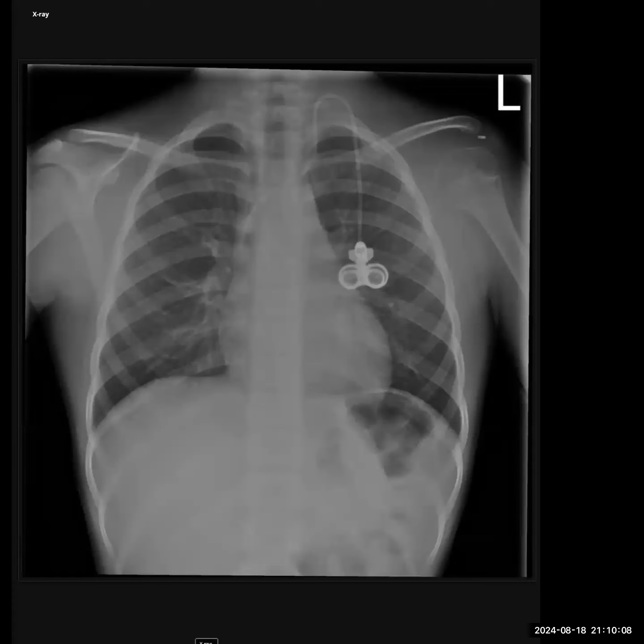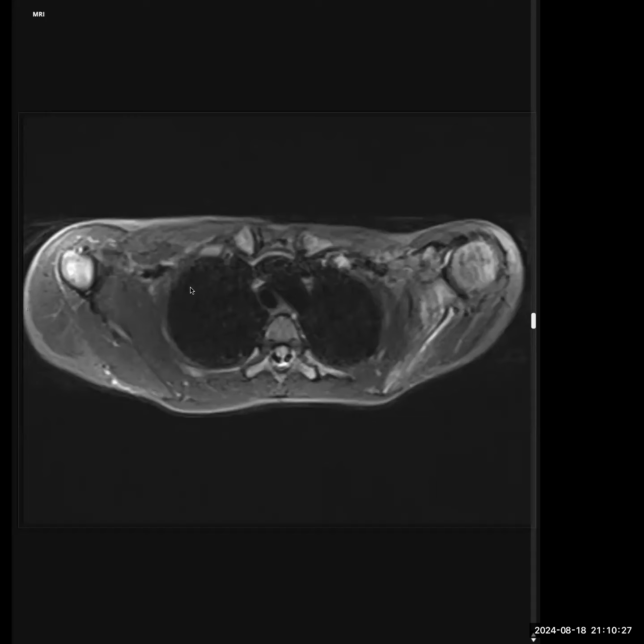I'm trying to rule out any metastasis. I've shown you the pre and post-op images, but what do you think? Did the patient have any other imaging in between? Yes, the patient will have, I think, MRI and CT for staging. You can look at the MRI if you want. Here you go. You can ask for control and I'll give it to you.